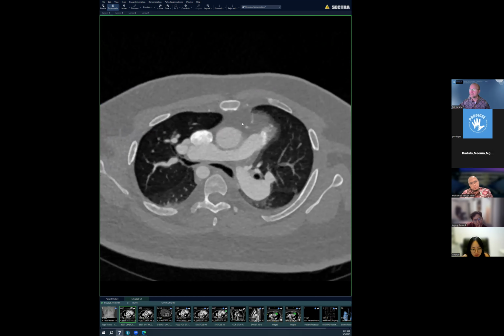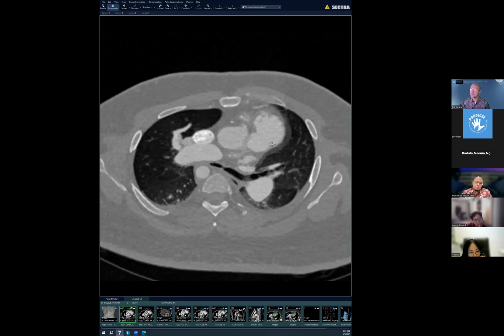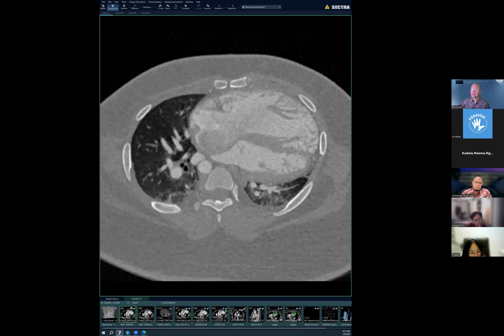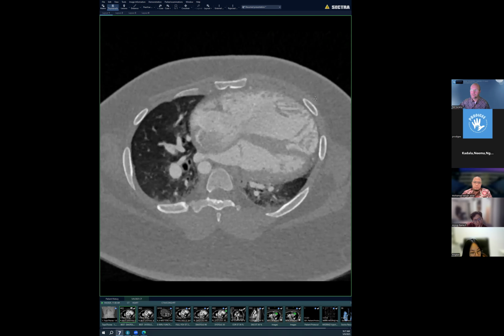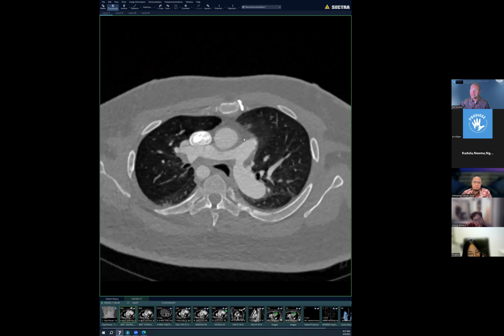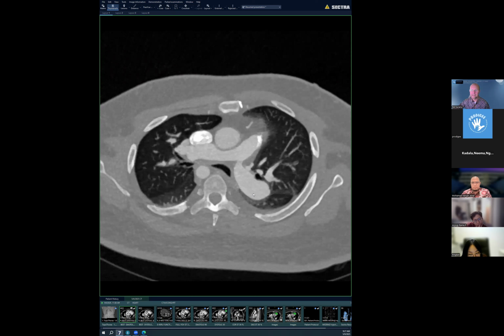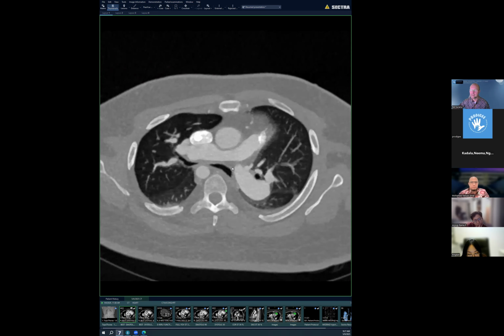This patient already underwent palliation for tetralogy of Fallot with a transannular patch that you can see here, the calcifications in the RVOT and at the level of the pulmonic valve. We don't see pulmonic valve tissue, so probably the valve was also resected. So this patient has severe, or free, pulmonic regurgitation, hence the markedly dilated right heart, very, very large right ventricle. But we can also see narrowing of both proximal pulmonary arteries with a post-stenotic dilation of the branch pulmonary arteries, both sides.